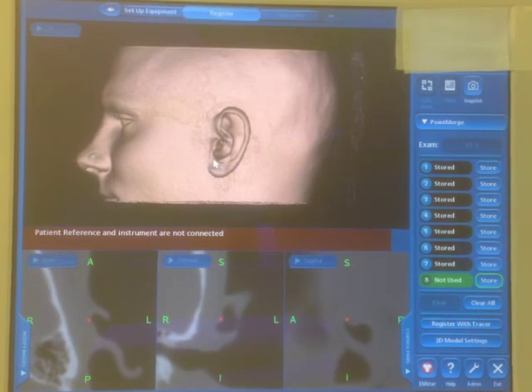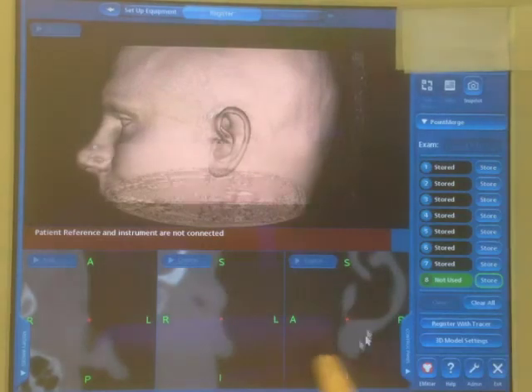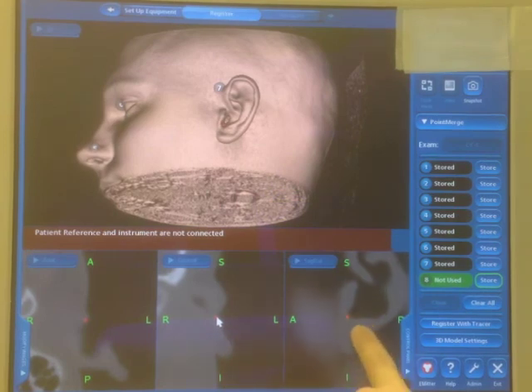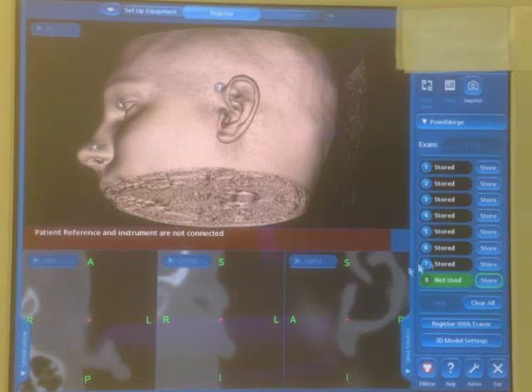And then the last one I'm going to do is the tragus antitragus. I'm going to be watching on the sagittal and moving the coronal until I see this square out like that. And it's 1 millimeter in.